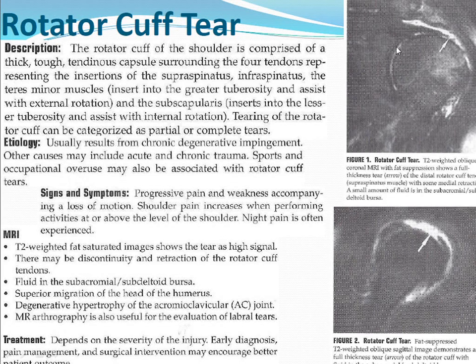You may see some fluid as well in the bursa, or you may be diagnosing this on a patient who's had an arthrogram, in which case the contrast just helps outline the tear of the tendon. The tendon is supposed to normally come all the way across to here and attach over here, but this shows that it's disrupted. And on this one, this is the oblique sagittal image. You can see the other tendon back here, and there's this kind of bald spot where the supraspinatus is supposed to be. It looks like kind of a bald head when you look at it on the sagittal images.